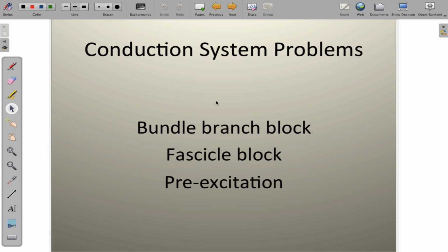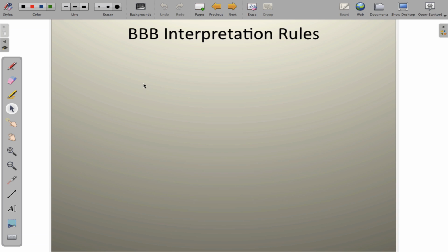All right, greetings everyone. In this video, we'll explore conduction system anomalies on the EKG. Namely, we'll look at what bundle branch block does to the appearance of the EKG. We'll take a look at how fascicle blockage appears on the EKG. And last but not least, we'll look at the pre-excitation problems that occur on the EKG and all of the associated changes. All right, so first and foremost, let's take a look at bundle branch block interpretation rules.